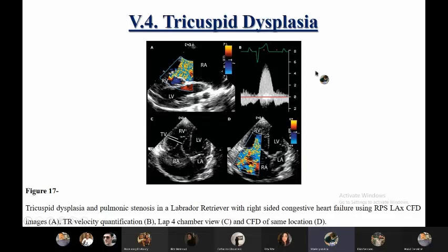It is not seen in these images, but was seen in the previous slides. So this is even worsening the prognosis in this dog. In C, there's extreme dilation of both the right atrium and the right ventricle. And similar to what was seen with the mitral valve, the tricuspid valve leaflets are tethering towards the right ventricular wall and the right interventricular septum. So they are long, they are displaced towards the apex, they are abnormal.